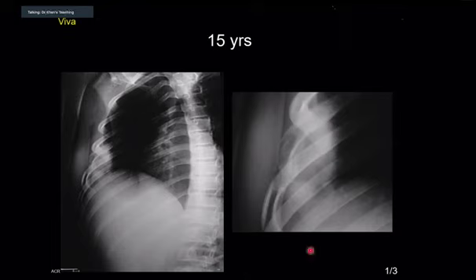Right. I will take over. Yeah. So if you see, this is an aggressive lesion once again. You can see that there is a lucency, there is cortical destruction in this. So once you get an aggressive lesion, according to the age, your differential changes. Yeah. Please remember multiple myeloma.